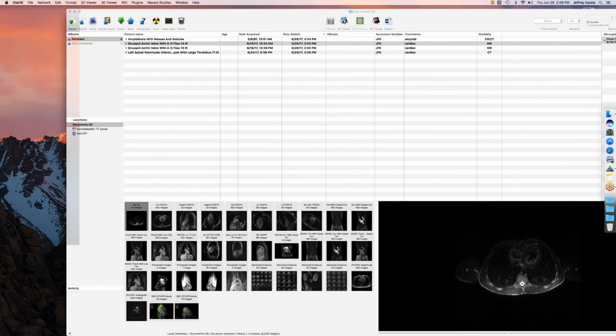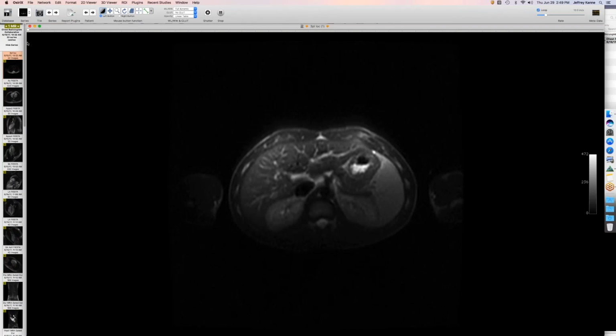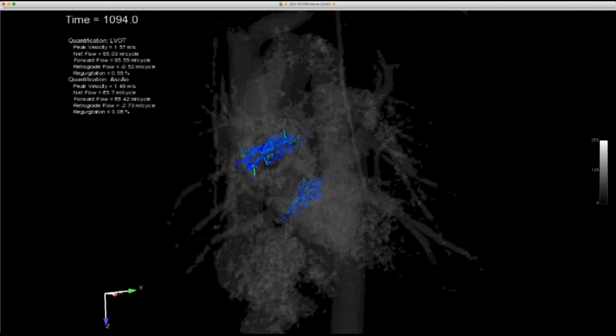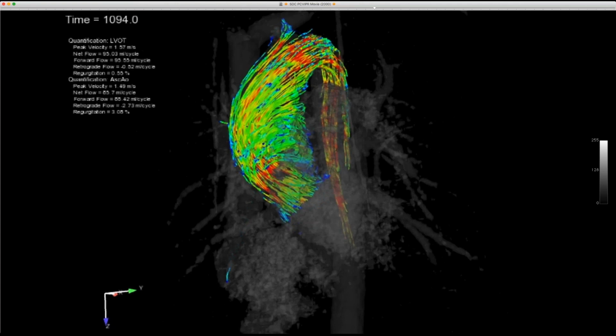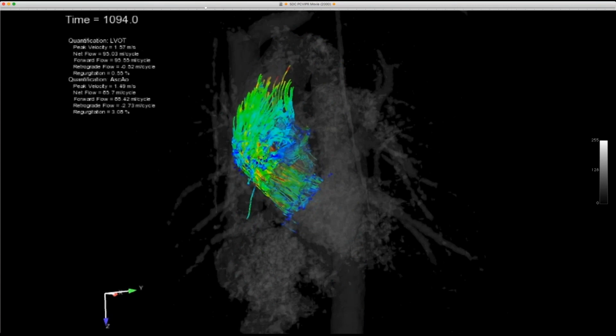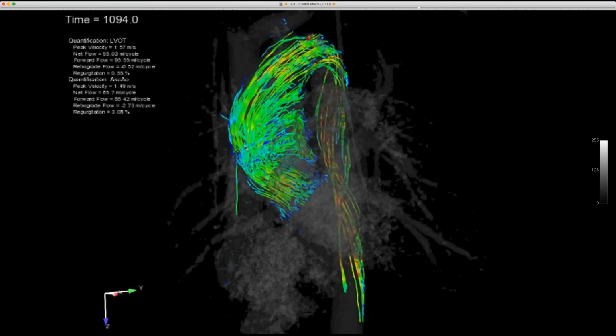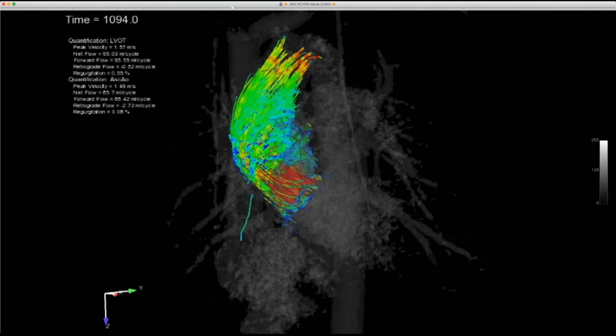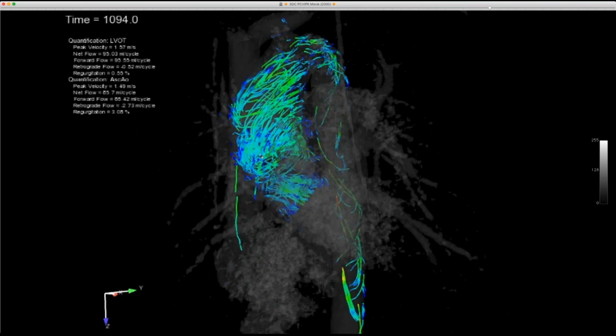These are two young adolescents who both have bicuspid aortic valves. I'm not going to show the whole MR, just the 4D flow, because it shows two different patterns of flow. This is the first patient. You can watch during systole, we see this jet coming out, and there's red flow along the more lateral wall of the aorta, and a bit of an eddy current going on here.